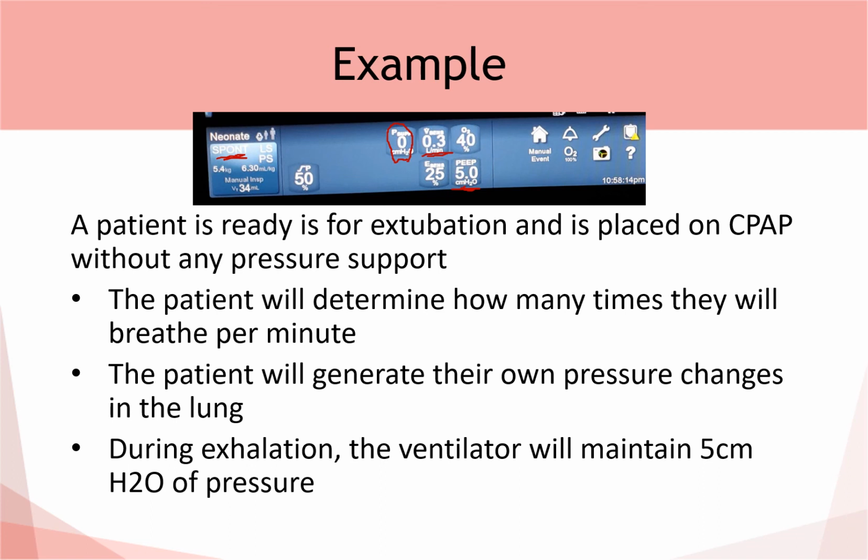In reality, for this patient specifically, even if they were taking breaths in, the flow trigger that we have here isn't really triggering a pressure supported breath. So for all intents and purposes of this example, this is not really a value that the patient is even using.